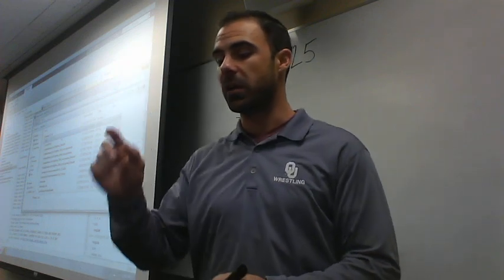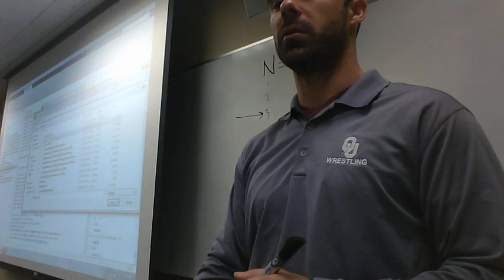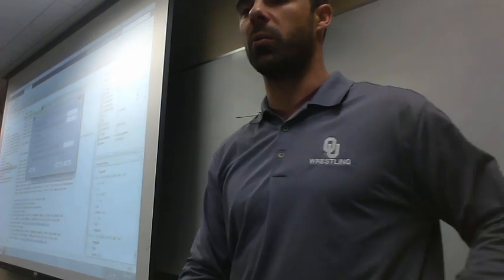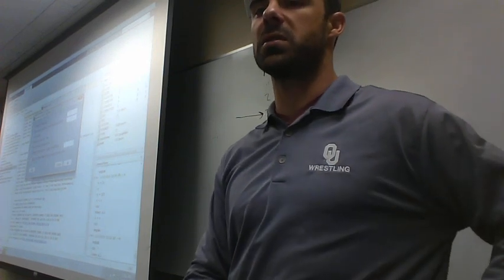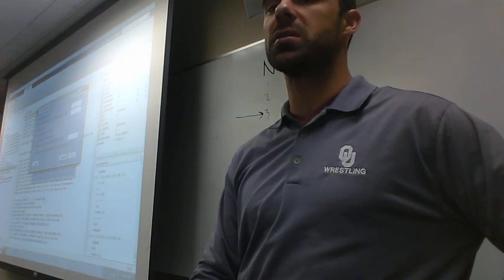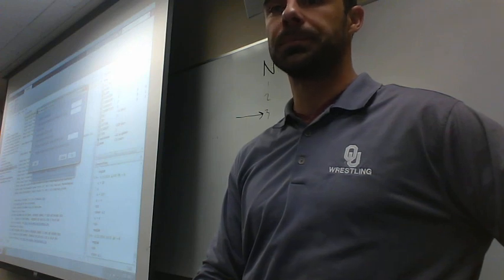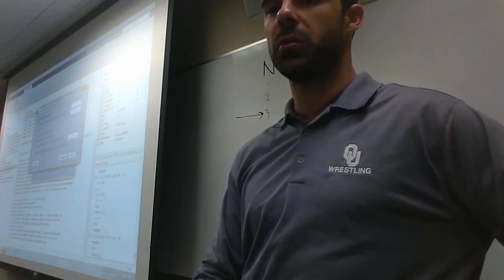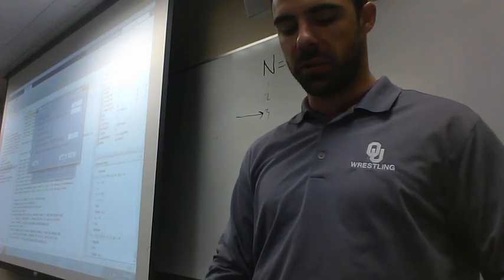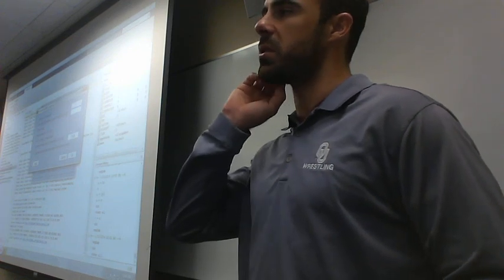I'm going to come back and revisit that point in just a minute. I want to make sure everybody grabs that file and opens it, because it's going to take a moment or two to open. We can talk while that loads. It's going to give you this blue box, and you're going to ignore most of this stuff. What we're going to do is just type in the number 33 and then space bar 34. I'll explain what that means in a minute.